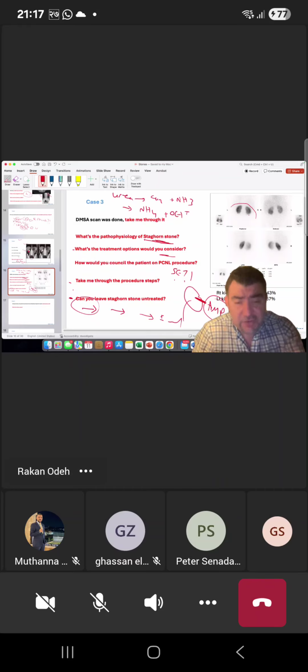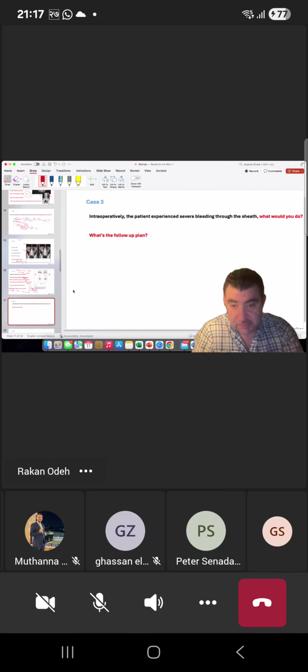Even in the technology station, there isn't much you say about a DMSA scan as a scan itself. It's not like the MAG3, etc. So nothing really concerning about it. I would just add there is good uptake here, suggesting good renal function, because the uptake might be equal but hazy. So this suggests low renal function. Good, good job. True, Ayman.